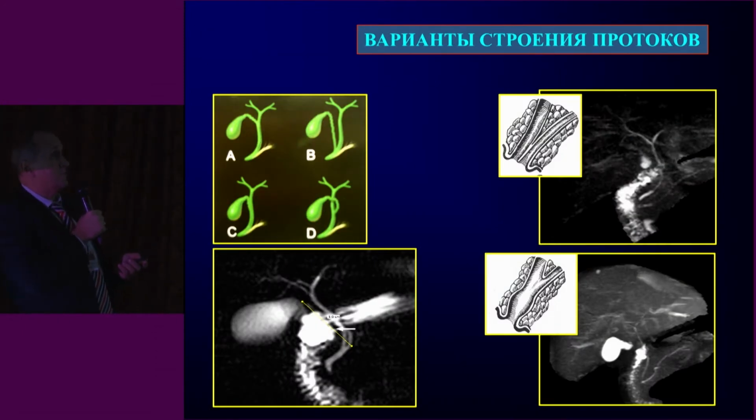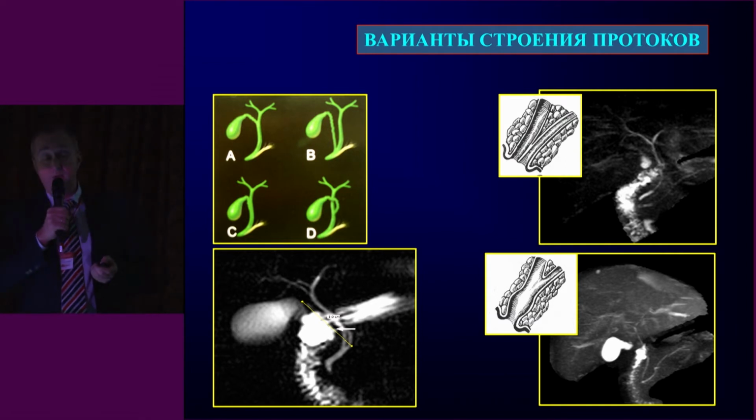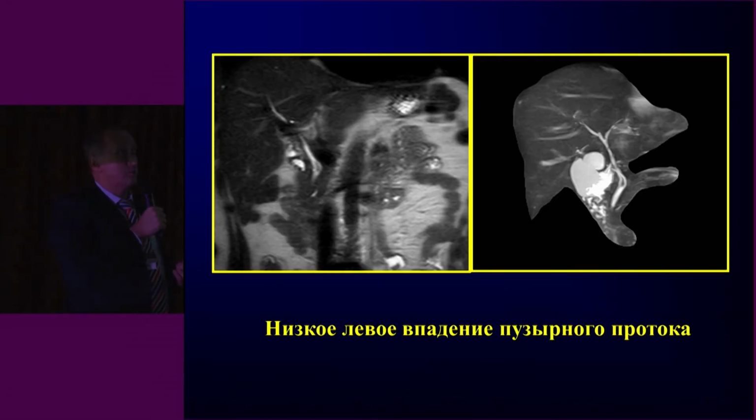We could see all parts of the biliary system and also assess its architecture, because if you would like to cannulate the major papilla, you will not obtain and cannulate the CBD. You cannot do it at the same time, and it's very important. You can analyze it during MRI.